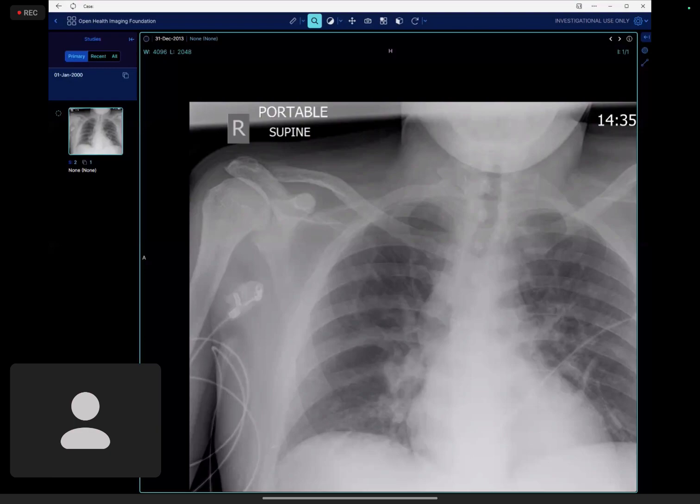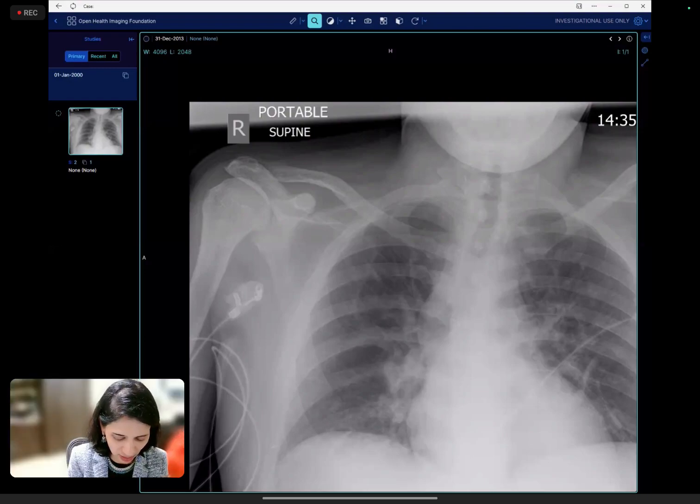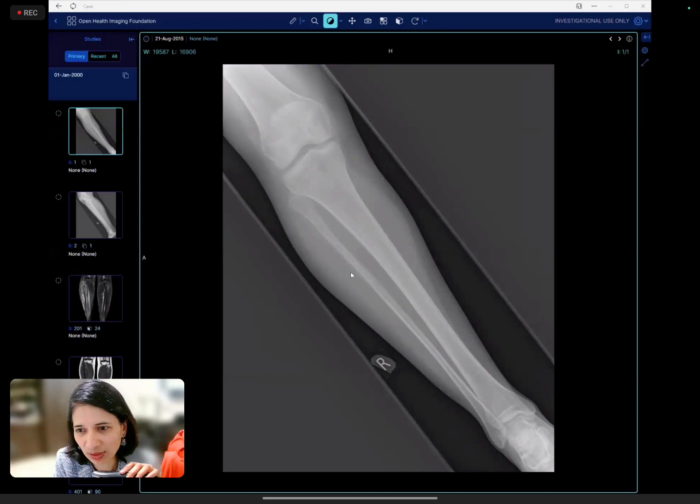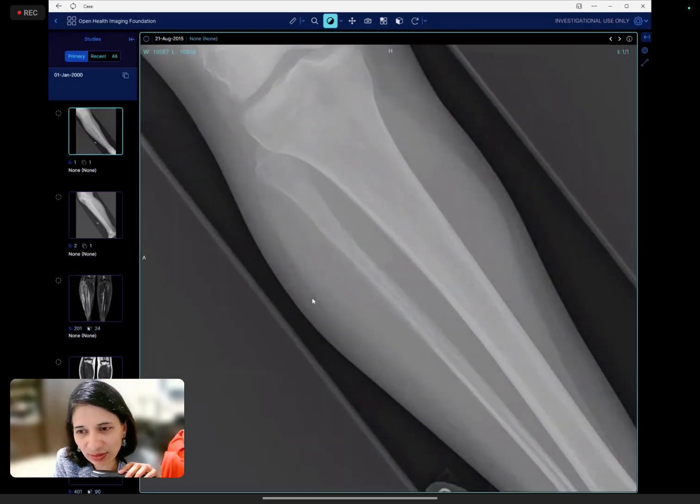Okay, so that is the other one. Then it was case number 27. So this one, you picked up well, because sometimes the fibula lesion is easily missed. Everybody is focusing on the bigger bones, and you can miss this. So well done, you described it well.